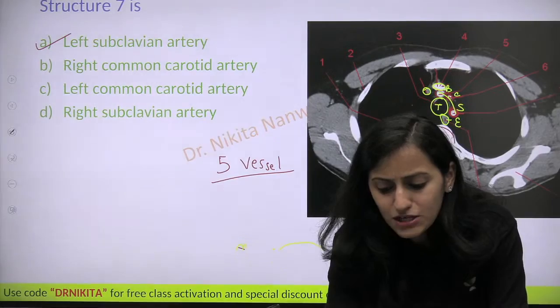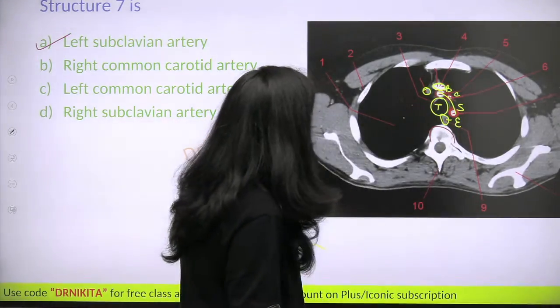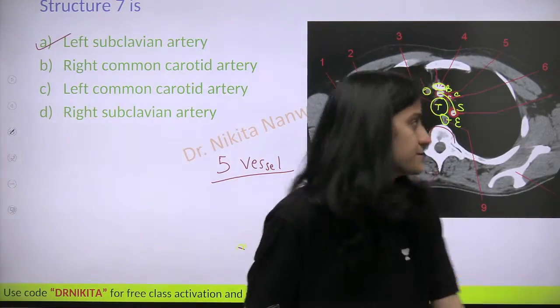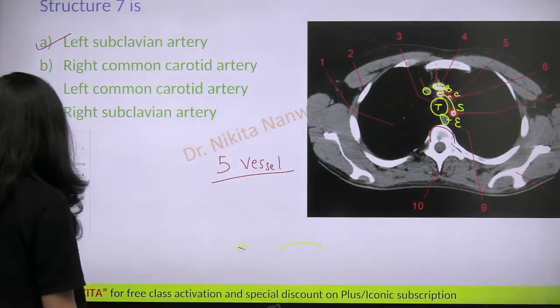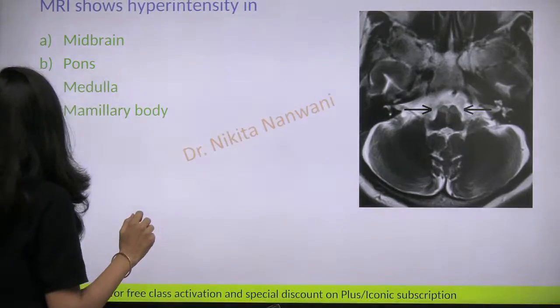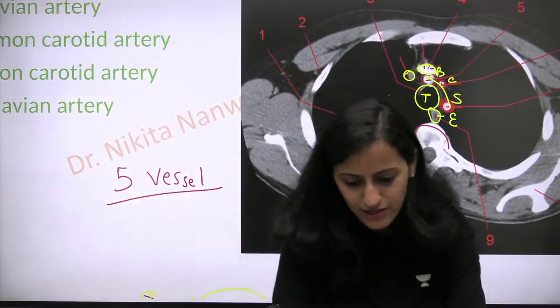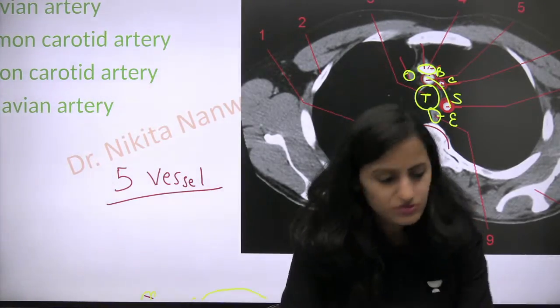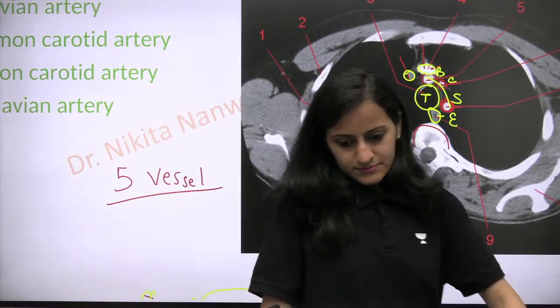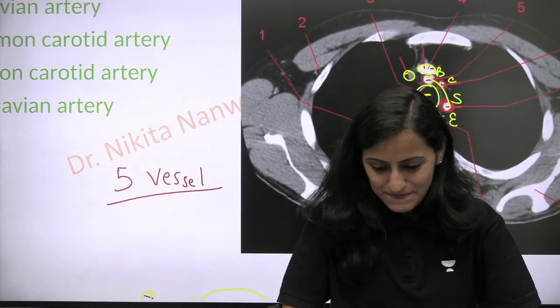Which right brachio is not seen, Nuzhat? Are you telling me about the contrast, the white color? Are you talking about the contrast? Why is it not appearing white? Are you talking about that? The brachiocephalic is visible, this is the brachiocephalic. Okay. All right. Absolutely right.